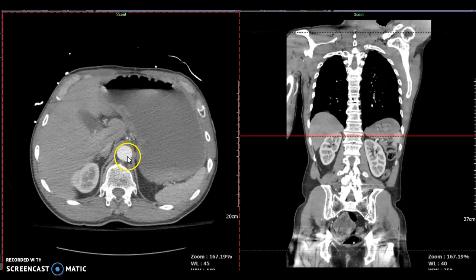Around the descending aorta, you look and see these lines right here that run on both sides. It almost looks like a wig on top of the descending aorta. This is part of the diaphragm. The plural term for that is crura, and on one side, or singular, would be crus. That would be a good test question to ask you for the exam. Surrounding or underneath this little wig, you find the descending aorta as well as the vertebral spine.